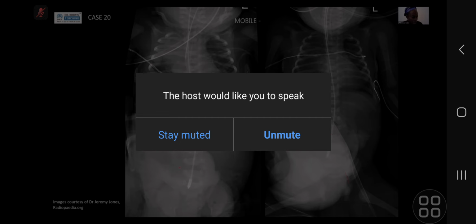But here you can see it's abnormally located, and it keeps coming down the midline, and the gastric bubble is abnormally located. So that suggests that the stomach is not where we would expect it to be. And then here we've got all this abnormal opacity with some areas of lucency, as you described, which represents the extruded abdominal contents. So this is a gastroschisis or an omphalocele, but often we can't tell the difference on imaging unless we know it from the antenatal diagnosis or from when the child is born. But yeah, so this is herniated bowel wall contents through a defect in the abdominal wall.